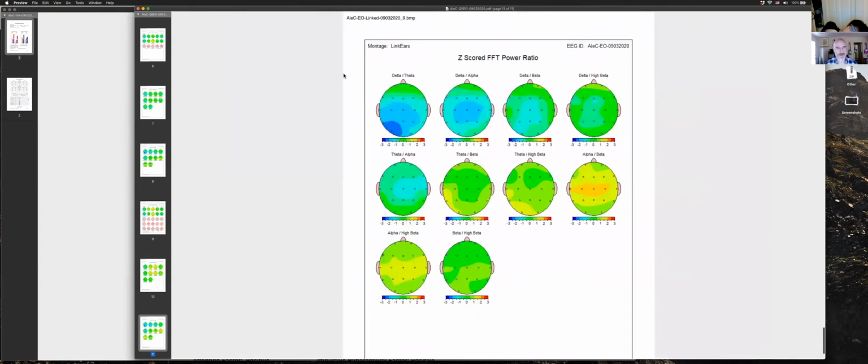Okay. There's 3 rows. The top row has delta in the numerator. Things in this row predict sleep issues, generally. So this is your apnea, probably. Keeping the back of your brain from getting rest. Middle of the brain, the middle row is executive function, attention, ADHD.